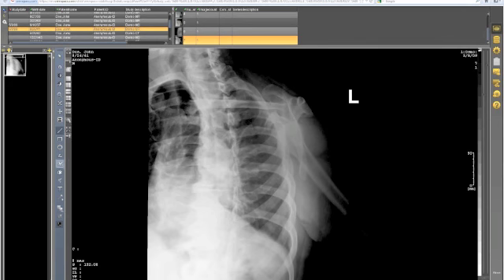Over here we have a full suite of measurement options. I'm just going to quickly review these right here. This one, it measures everything in metric units. You can click and drag this away. You can also delete the markings from the images. So these are all pretty basic features, but it's just a matter of knowing that they're there.